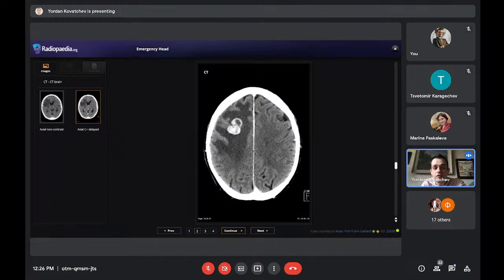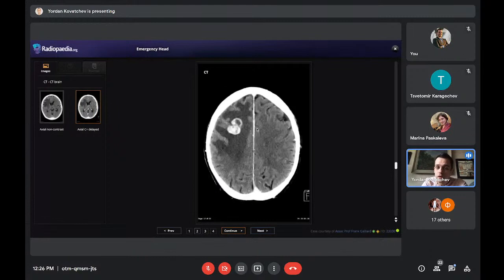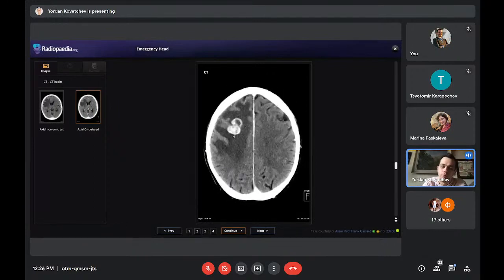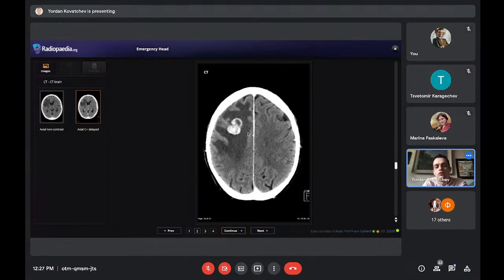If there is any suspicion of sepsis in this patient, this could be an abscess. And it's really important because it's life-threatening, like literally hours away from death when it ruptures. Whereas a metastasis, this will take a long diagnostic and treatment period, excision, and so on. But if this is an abscess, it's an absolute emergency. You need to do an MRI. And anyway, this is for another talk to show you what the changes are there.